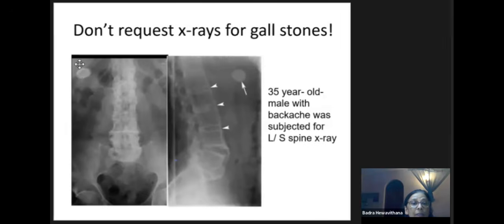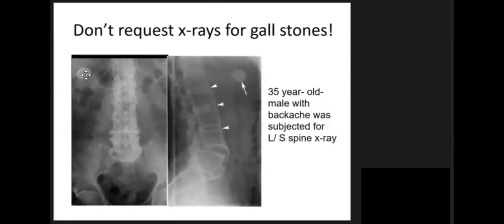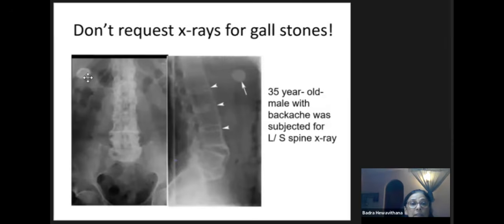before the ultrasound era, to find out whether it's a renal calculus or a gallstone. So I told you before that lucency inside takes you to the diagnosis. But the other reason I showed you this is, if you don't see this translucency, like in this one, do a lateral X-ray, if you don't have ultrasound for some reason.